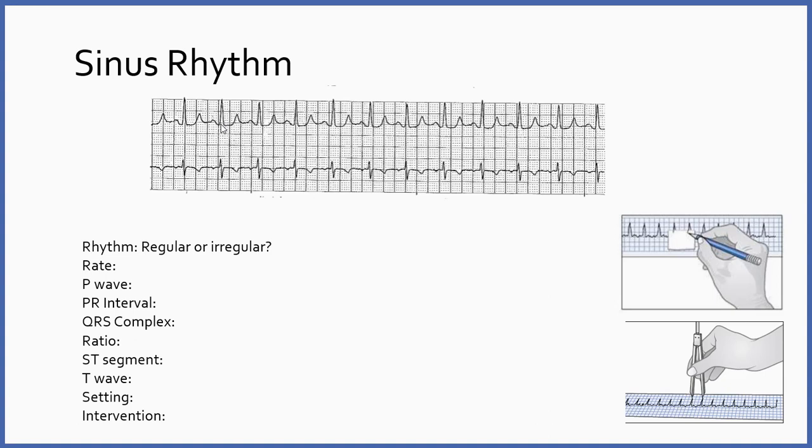Now, sinus rhythm, because I know that's on your handout, is considered normal, but as you can see, as I said, there are some things we need to look at, some potential problems. Remember also that just because you see this lovely electrical pattern on the monitor, your patient isn't necessarily stable or even alive. A patient can have this rhythm on the monitor and be dead. No pulse, no response. So no intervention, though, is needed as long as the patient is alive and hemodynamically stable.